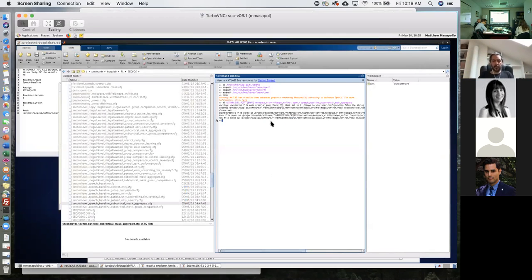And what I was seeing with those masks when running the original analysis, the original version of the software, was that those masks were actually removing some portions of the ventricles, in addition to the borders of the cerebellum. But I cannot see it in these displays that I'm showing you. So I'll just try to figure out which particular subject was causing this original mask to be the way that it was, and then I'll look at the data for that individual subject to see how that happened. But I cannot see it from these plots anyway.